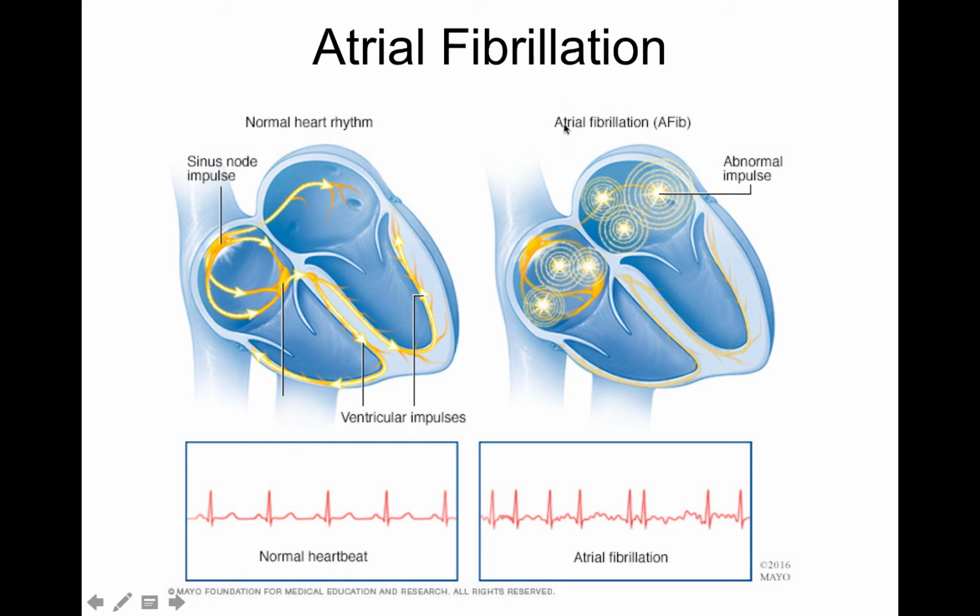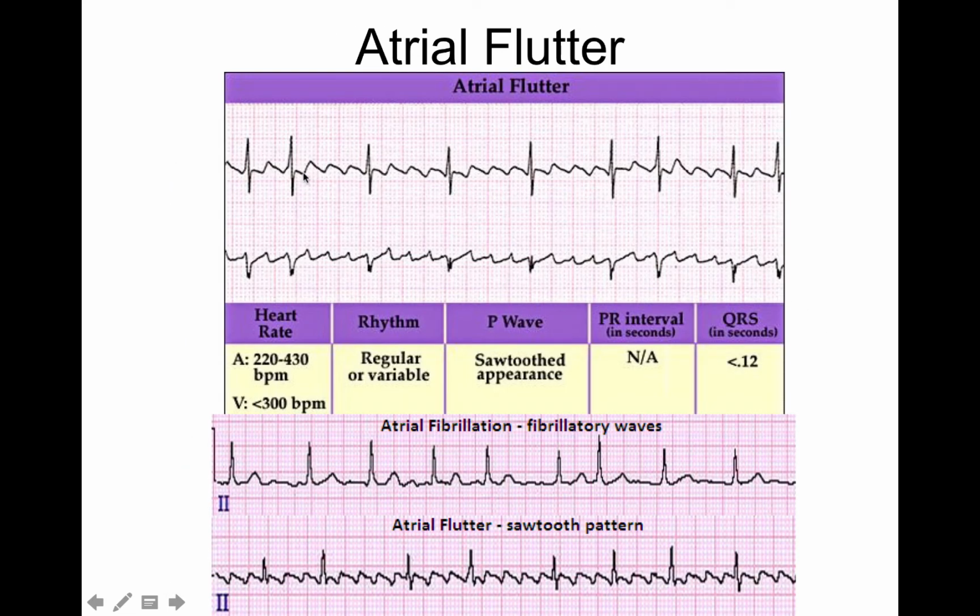consistently where the atrias are firing more than the ventricles are. So the heart's having a seizure, this is beating, then stimulates an impulse. This is beating, stimulates an impulse. It's like each person's got their firing squad and they're ready to go. With atrial flutter, what happens is you're going to have a foci of the atrias that are just beating a lot faster. So atrial flutter, this is the coolest rhythm to me, I think of flutter, they're waving to you, waving, waving, waving. Then you have an impulse, and so you're going to see the P waves.